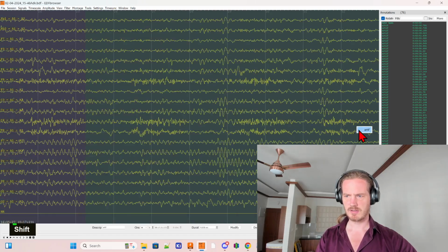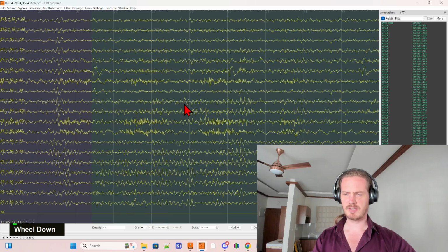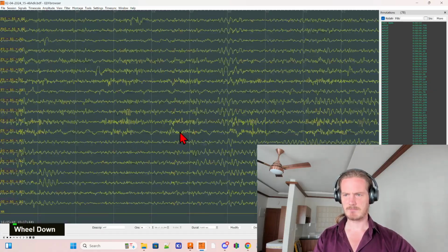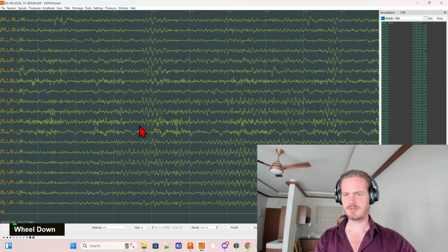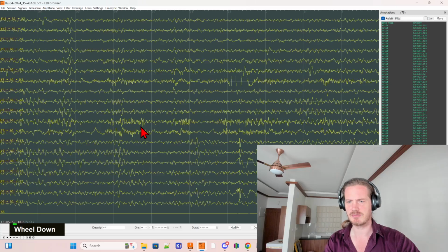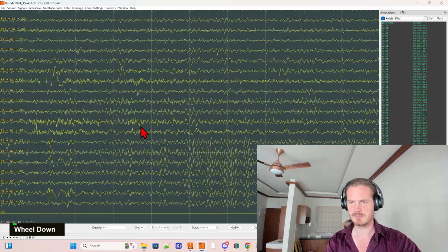Jeez. We're losing a significant amount of data here on this person. But now we're getting some good stuff. Essentially, out of 10 minutes of recording, you definitely want to have at least 3 minutes of clean data in total. And we're getting that here.